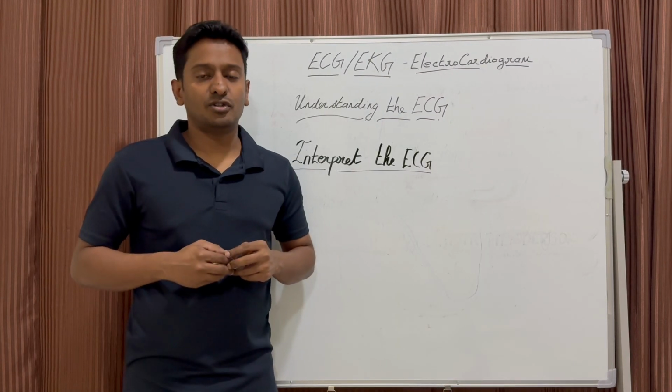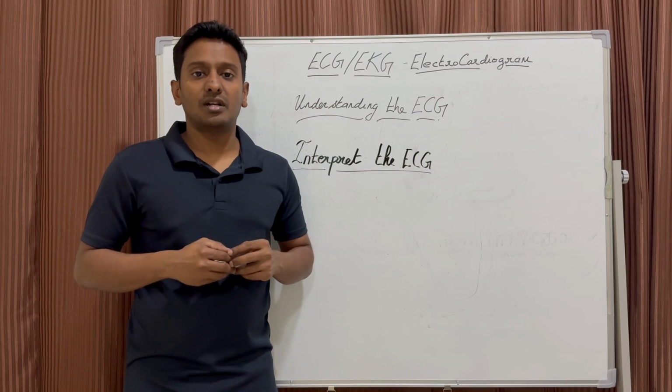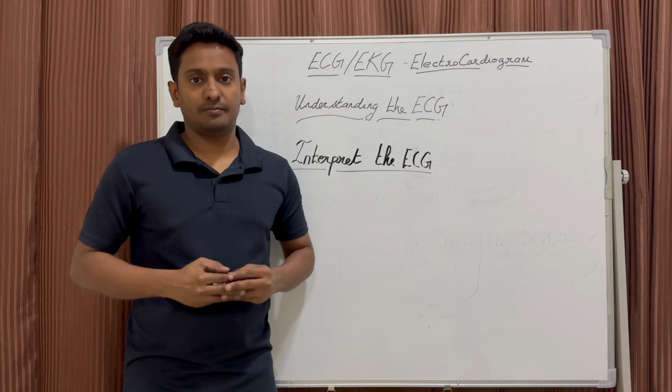Finally, interpret the ECG. After going through the steps, we will come to a conclusion regarding the ECG rhythm, whether it is normal or abnormal.